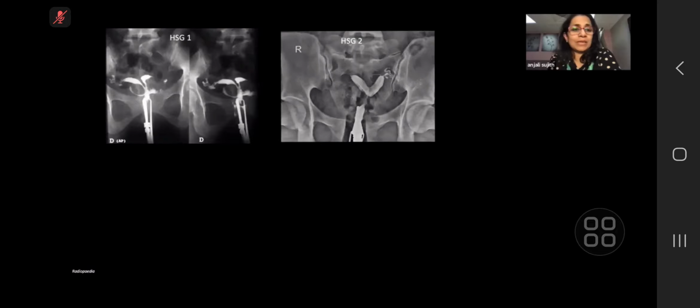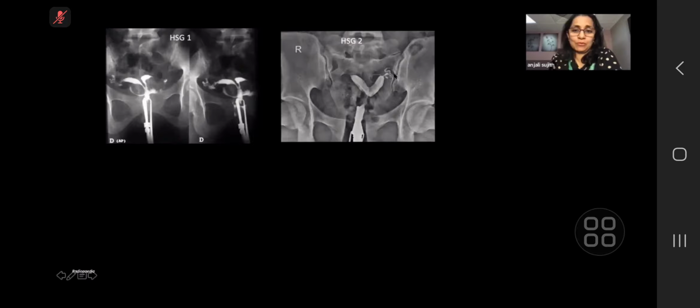Okay, forget about the peritoneal spillage. Let's focus only on the morphology of the uterine cavities. So definitely two normally formed, separate uterine cavities that then join into a single cervix. So this would be consistent with a bicornuate uterus. Okay, and what about the one on the right side?